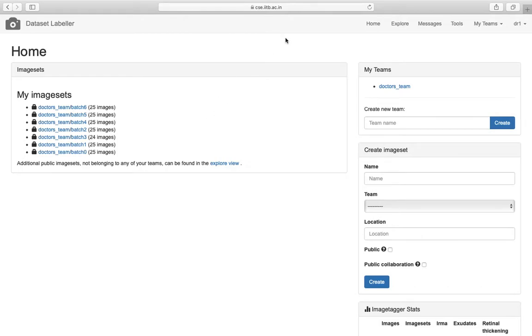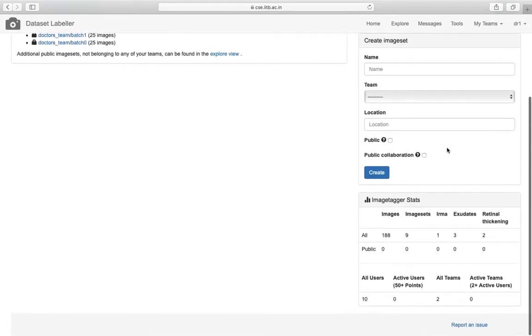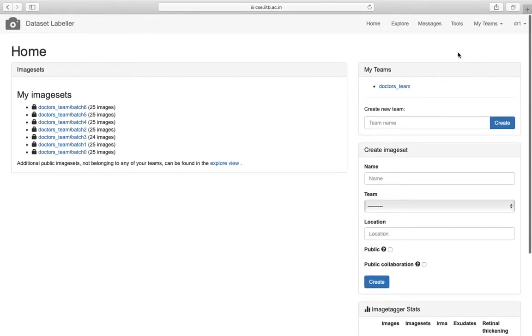The moment I log in, I reach my home page. On the home page, to your right, you'll see all of this, which doesn't really concern the grading doctors. This is more for the team of website developers. To your left, you will see image sets.